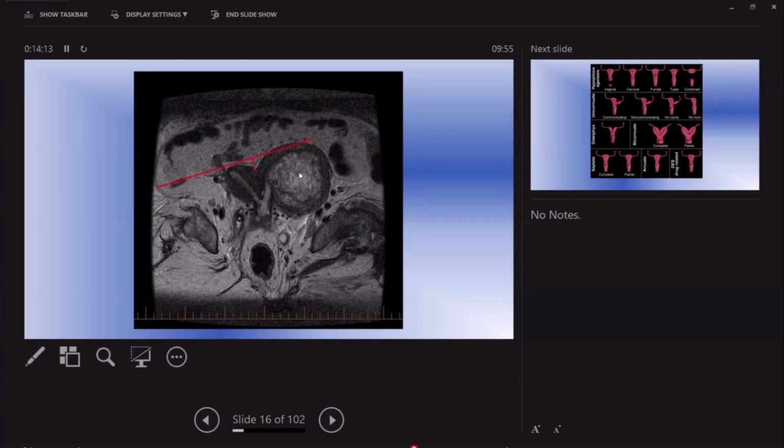It's endometrial because the epicenter is really coming from the endometrium. I look at the endometrium here, I lose it, and then I find this well-defined, rounded, heterogeneous, predominantly high signal intensity mass within the endometrium. And then I see that there is a myometrium surrounding this mass all over. So now I know that I am dealing with an endometrial-based lesion.